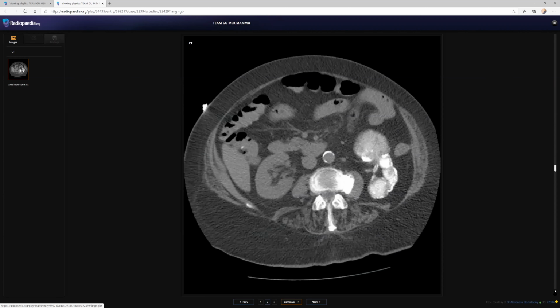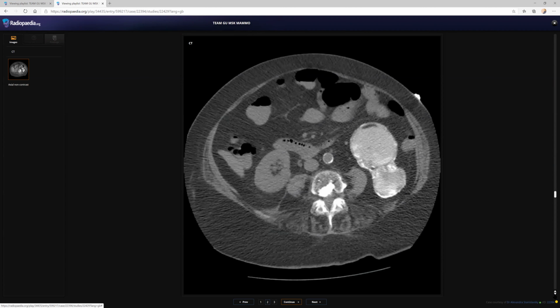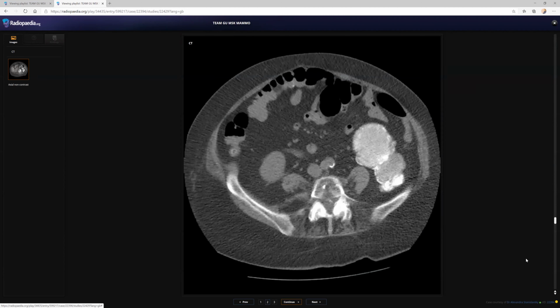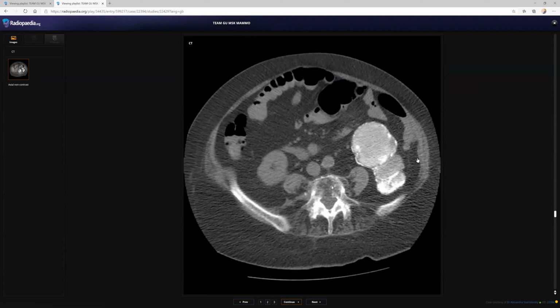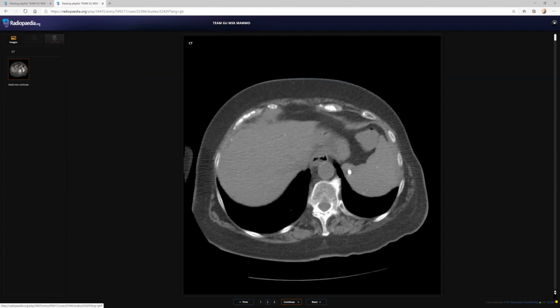Okay, so that's the CT exercises non-contrast images. It's very slow actually. So I can appreciate there is irregular calcification involving the, it's not moving actually. Sorry. I'll do it. No worries. Thank you. Okay, 1 second. Next time we'll practice before the session. Yeah, I know that, but it's very slow actually. Okay, I'll move from above downwards.